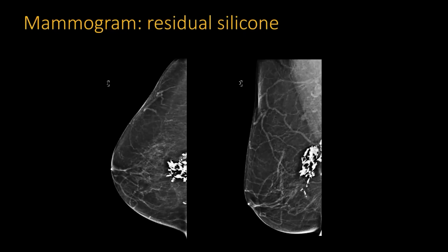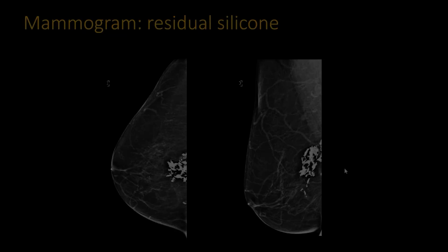You can see that the silicone gel just stayed in the breast forever. If you try to remove that, the surgeon will cause a loss of contour and deformity of this breast, so lots of times they just let it stay there. Sometimes it can also go to the lymph node. So don't be confused with calcifications and recommend biopsy of that.